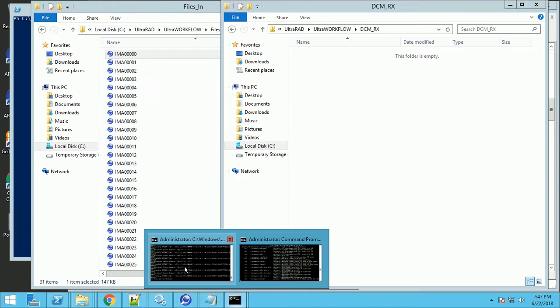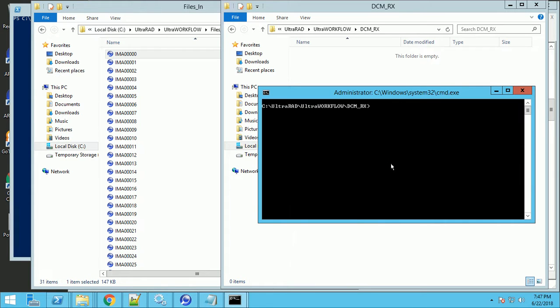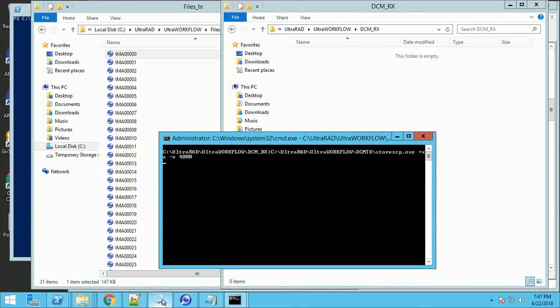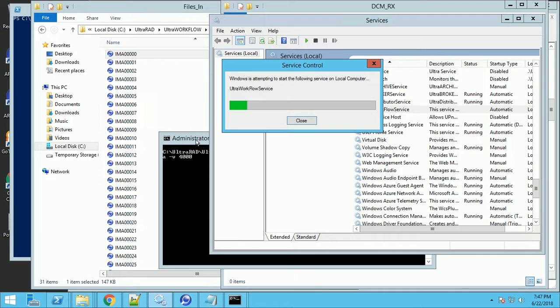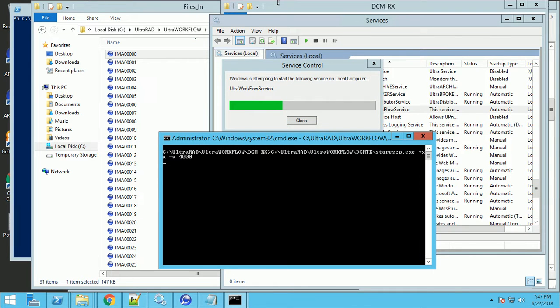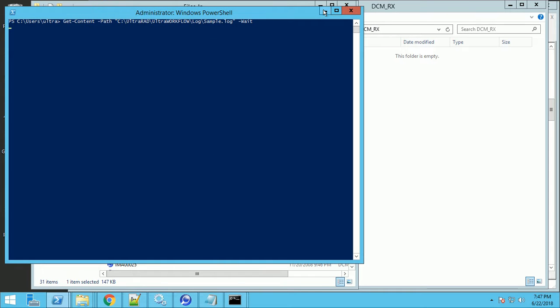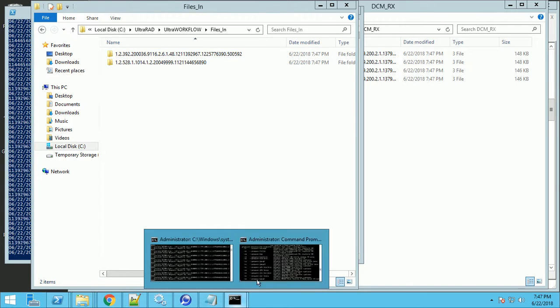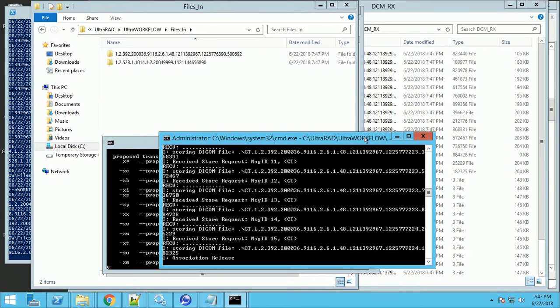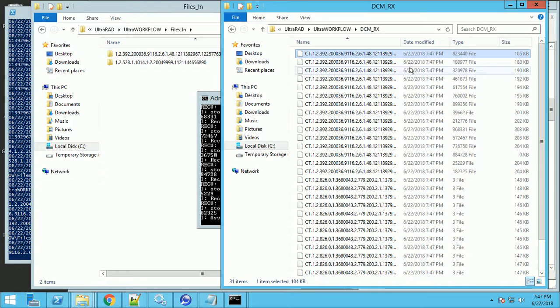Let me bring up the command over here. So just to start this from scratch, I'll let this command line run, and we'll watch all of this happen in real time. So let's start this. We should see lots of activity. I'll leave this behind, and we can always go analyze this later, but we'll see it in the background. And there's all the files that got received by store SCP. You can see they're all over here.